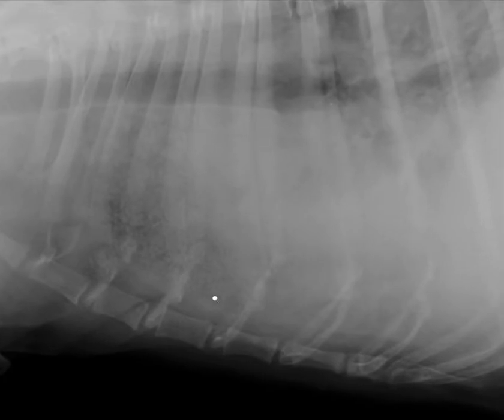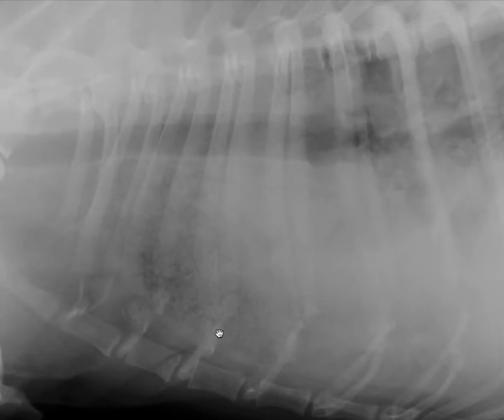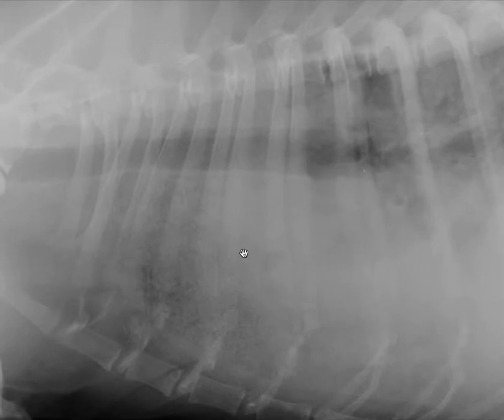When I get really close in here, what I'm starting to see is an appearance that I would call sort of stippled. Do you see how there's interdigitating soft tissue and gas opacity, and it almost has like a sponge-like or a dot appearance? I often describe this as stippled, and this is a special lung pattern conclusion for me. I tend to call this a vesicular lung pattern. A vesicular lung pattern is something that is characterized by not only inability to see the pulmonary blood vessels, but this interdigitation or sort of stippled appearance.